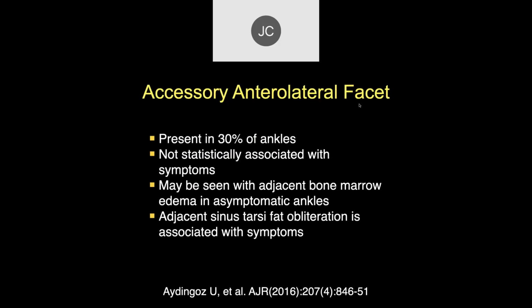Now, if you look closely, some people believe that you can see this commonly in ankles. This particular paper said it was not statistically associated with symptoms. So be careful, don't overcall this if you don't see the degenerative changes and the bone edema.